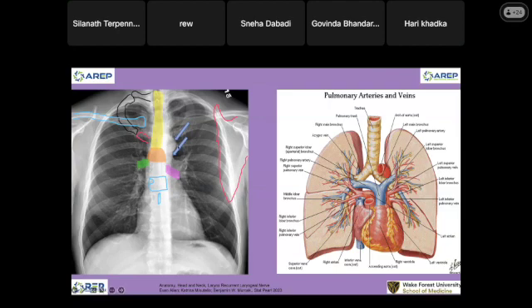So this is the AP window, the aortopulmonary window between the aortic arch and the left main bronchus. This is the left hilum, or left main pulmonary artery. This is the upper lobe bronchus. This is the middle lobe and the lower lobe. We should call it hilum, because the hilar structure is the whole thing.